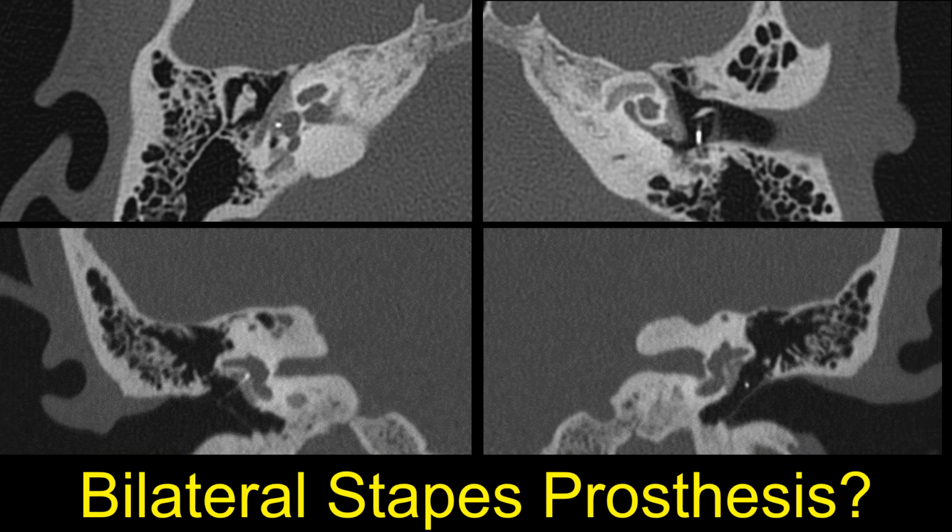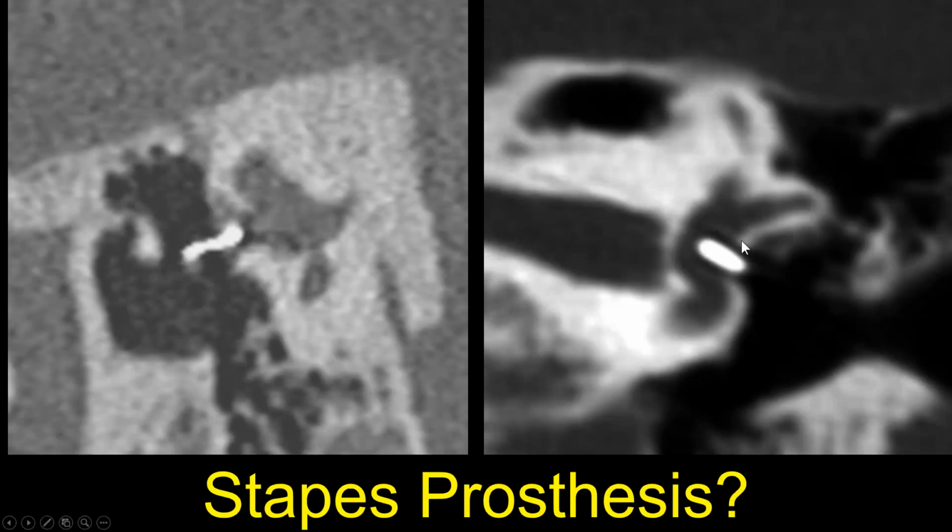Now, I was looking at these cases years ago, and I was talking to my neuro-otologist because it looked like a lot of the prostheses seemed to extend way through the oval window niche and through the oval window into the vestibule itself. So I was trying to talk to them about the different models that we had that were steel or fluoroplastic that showed up very differently on our imaging, and trying to differentiate all the different models because they're constantly coming up with new makes and models of these prostheses.